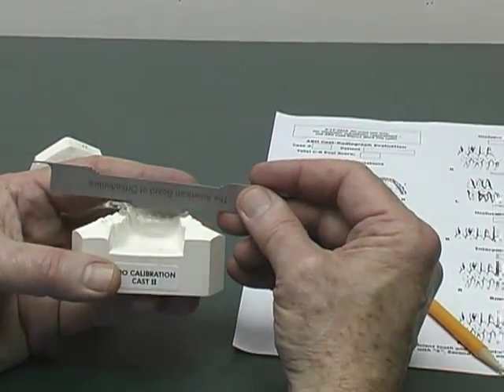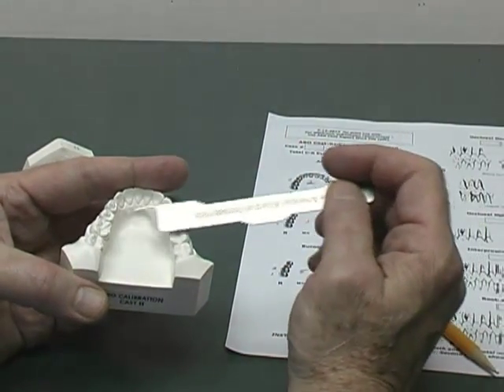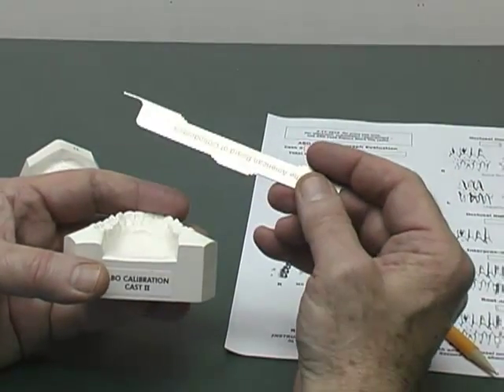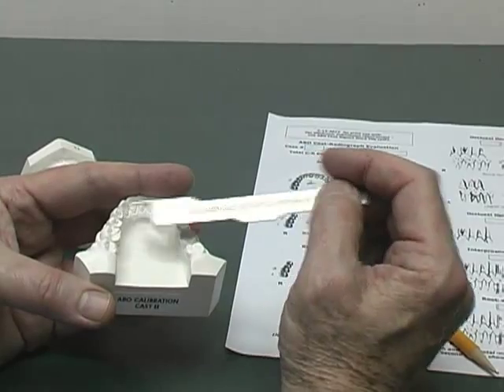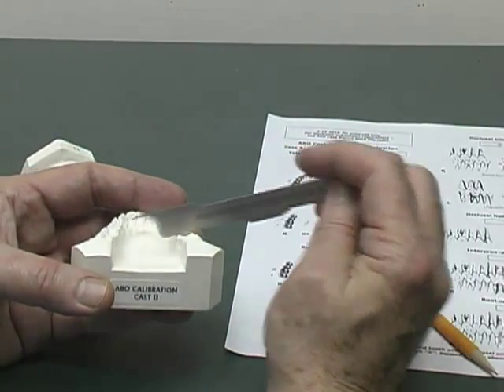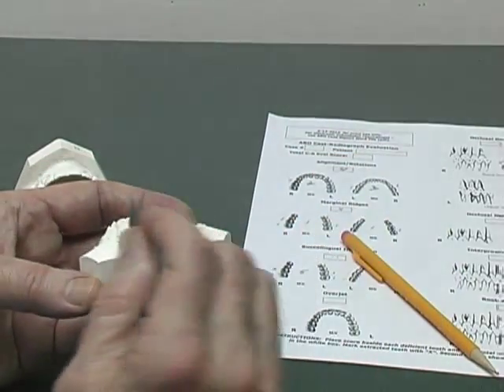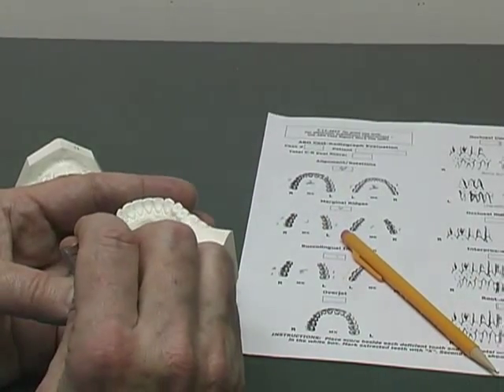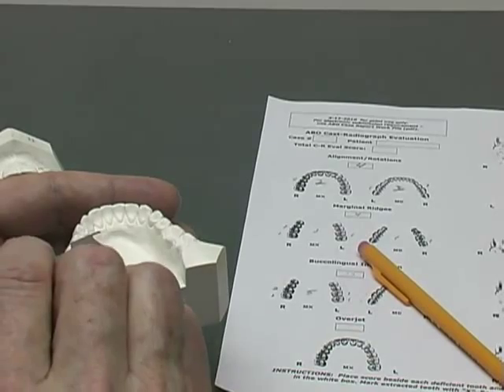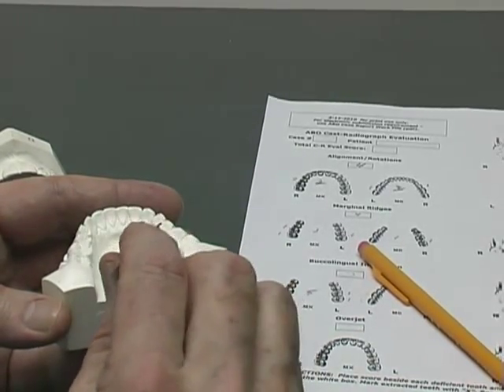Now we move to the premolars. First of all, the first premolars in the lower arch, based on the rules, are not scored because they commonly have a diminutive cusp tip. Usually the second premolars are scored, however, but in this case, I don't know whether you can see this on the video or not, in my opinion, these lingual cusp tips are small, and therefore I will use my judgment not to score the second premolars.